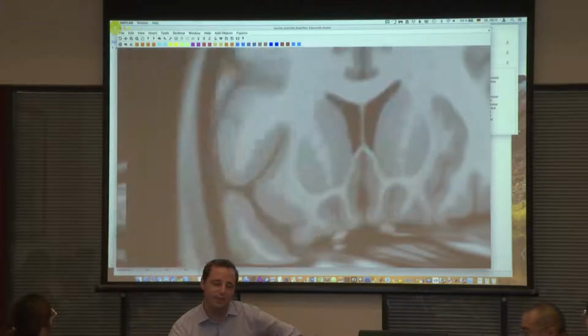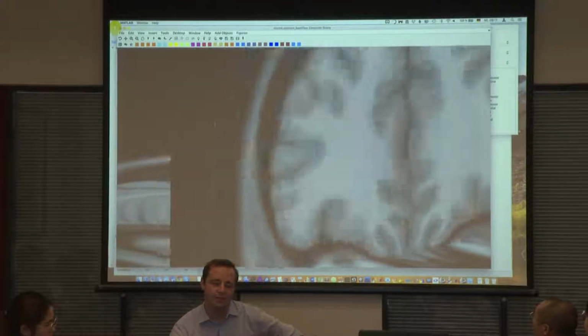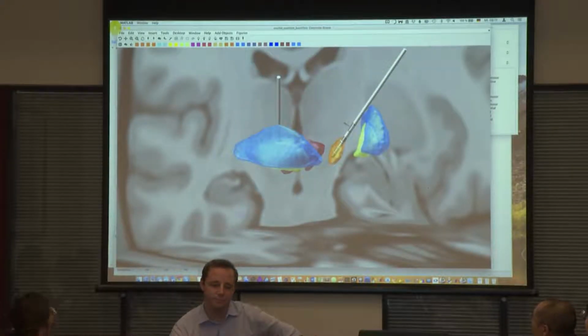But you can only do that if no other tool is selected. So basically, you have to click on this second button with the four arrows, and then you can move them around like this.